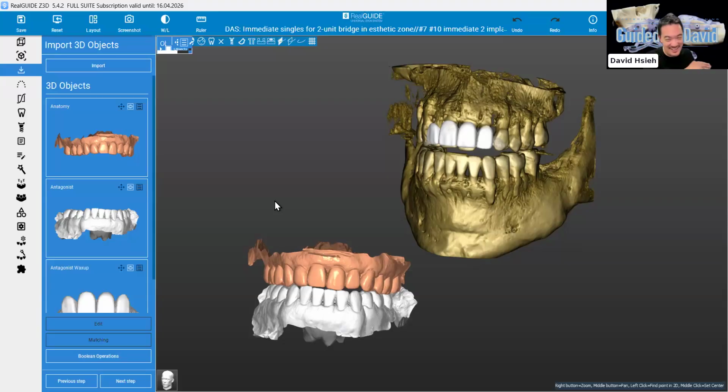Right? So guided surgery is not 100% accurate. When deviation happens in the planning phase, the majority of it happens here, meaning the merging between the model and the CT scan. This part is critical, critical, critical. And working as an implant planning specialist for the past couple of years, one thing I learned is that the merging ability is one of the core abilities for surgical planning.